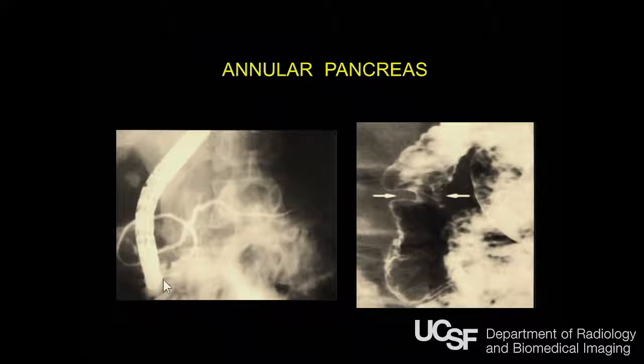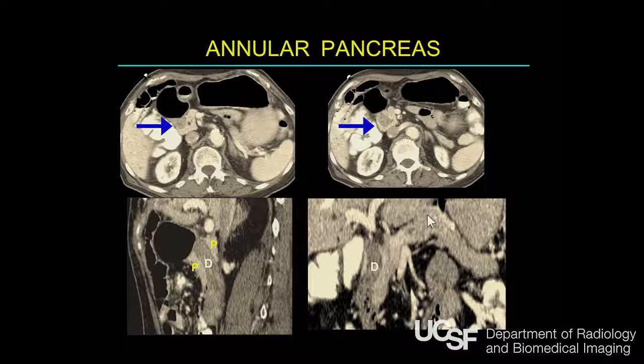And this is, again, where the scope is sitting in the second duodenum. You can see the injection of the Wirsung duct actually comes and circles the scope, which is in the second duodenum, and then crosses midline. All right? On upper GI, what you would see is just a short segment circular stenosis. And here's a patient. You can see you can actually follow the duodenum straight into the pancreatic head, which is enlarged. All right. Use your multiplanar reformats to really trace out the duodenum that enters and traverses through that pancreatic head. All right. A pretty easy diagnosis here.